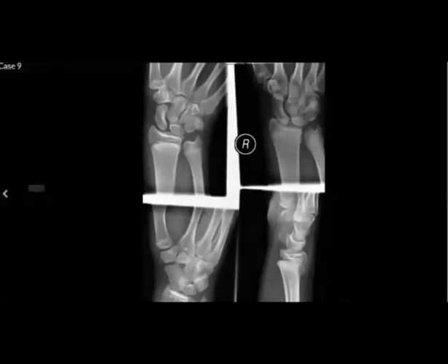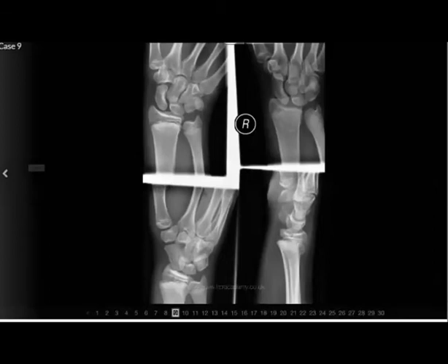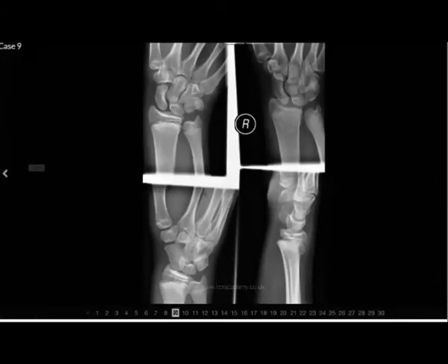So what do you think about this one? Sclerostosis. Can you revise again? Okay, I will try to.